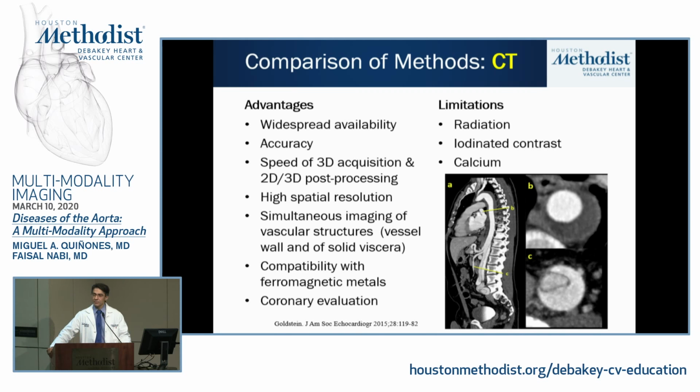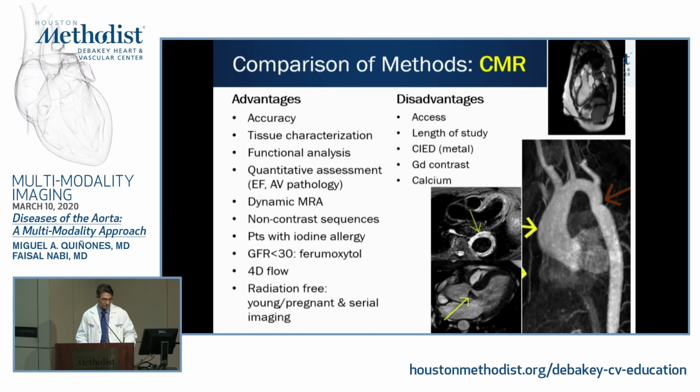And then calcium can be a friend and it can also be a foe. Sometimes with CT, it can cause a blooming artifact which can obscure the lumen and interfere with the interpretation of stenosis assessment. What about cardiac MRI?